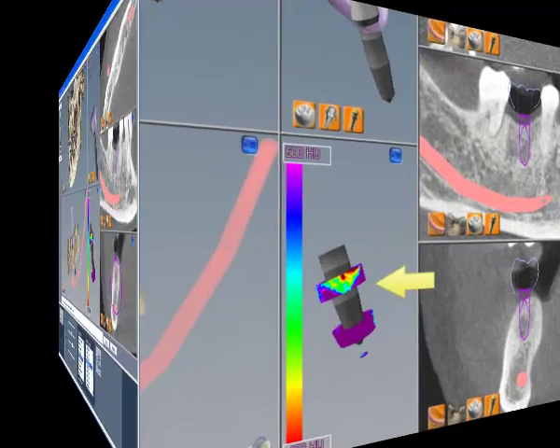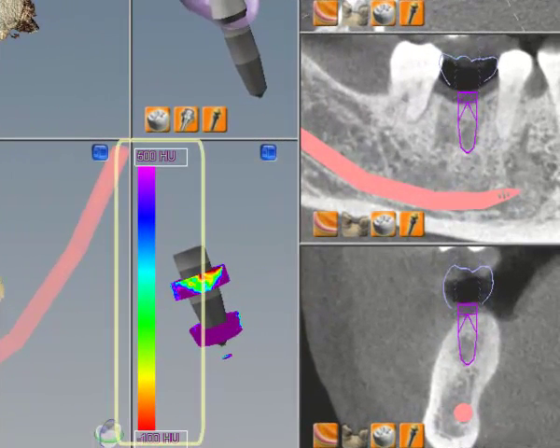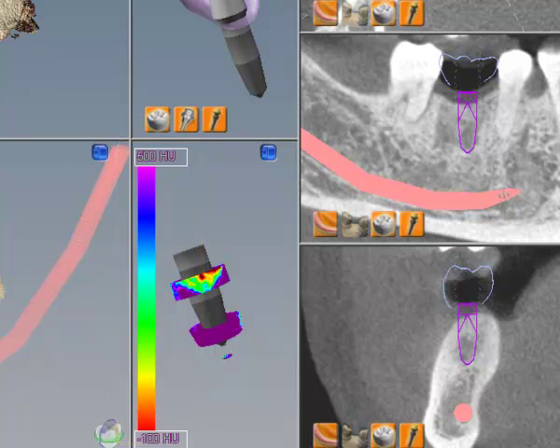The bone density view is a color representation of the Hounsfield values in the implant's placement location. Left-click the implant to toggle between showing the bone density color legend on the safety zones and directly on the implant. The safety zone represents a 60% increase in the diameter of the implant at each band location.